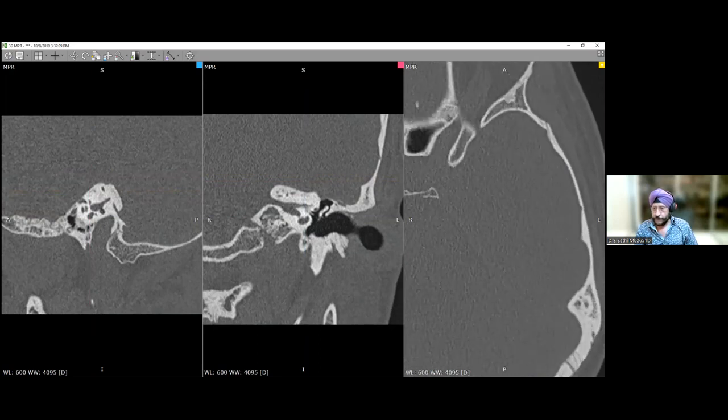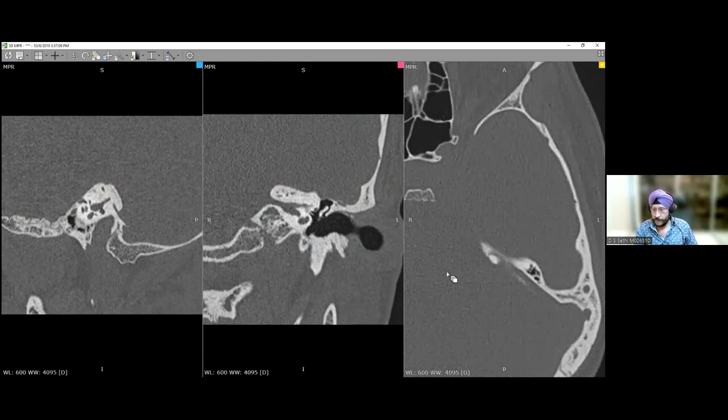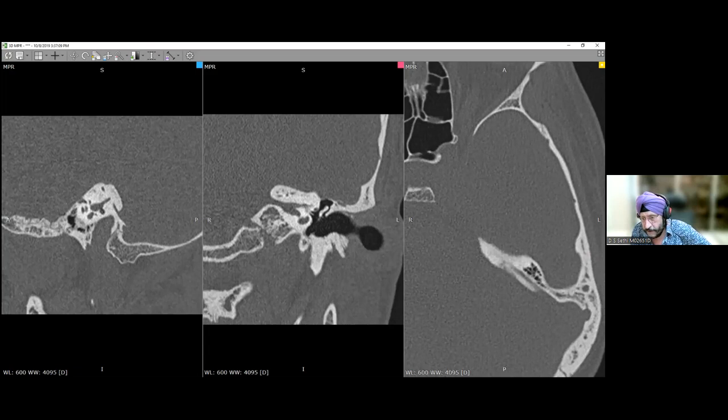We are going from superior to inferior. And like I told you, the first thing that you'll see will be the mastoid air cells. And this is already the sigmoid sinus. You haven't seen the arcuate eminence yet, or the superior semicircular canal. But what you see here is a very discernible groove. What is this groove? This is the groove for the superior petrosal sinus. Now let's go more inferiorly here. See, it's very discernible. This is the groove for the superior petrosal sinus.